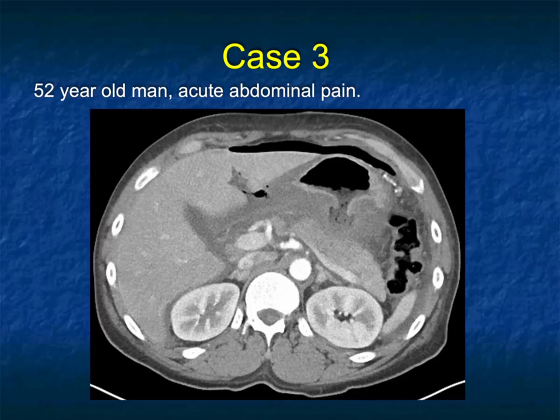Here's another case, acute abdominal pain. The thing that's most impressive here, first of all, is this pneumoperitoneum. So now we're thinking, in a patient without surgery, without trauma, pneumoperitoneum, there are many causes, but most commonly I'm thinking about a gastric ulcer, and I'm thinking about diverticulitis with perforation. Of course, this lecture is on the stomach, so it makes it easy.